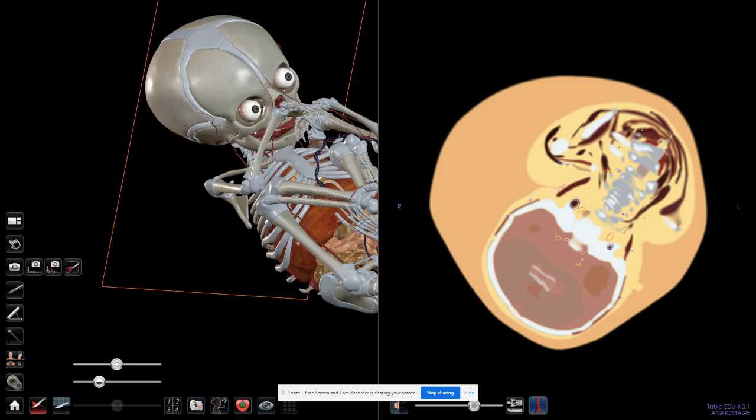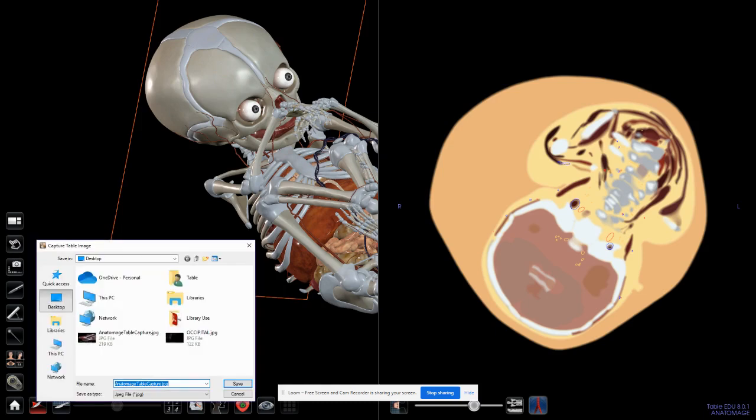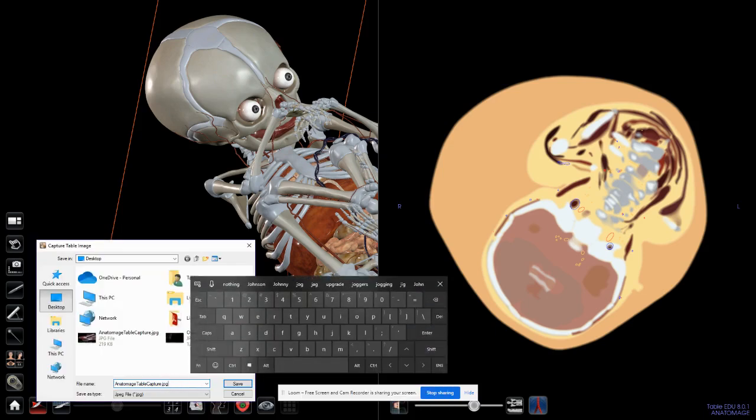The screenshot here, or the camera icon, allows me to either snap or take a picture or capture a screenshot of the whole screen here. But say I want to do so and I want to name it. Do not use the naming from here. Why?